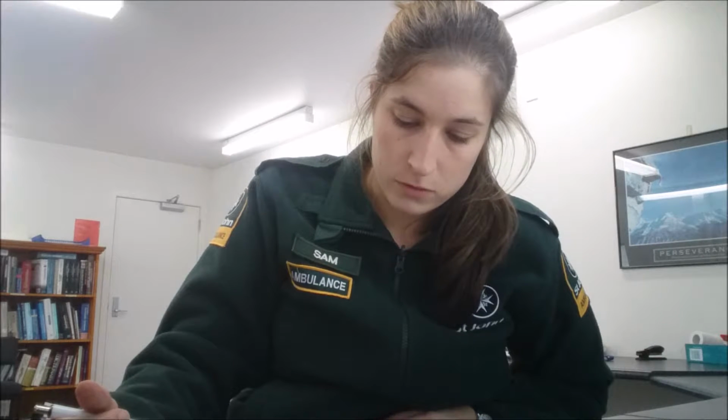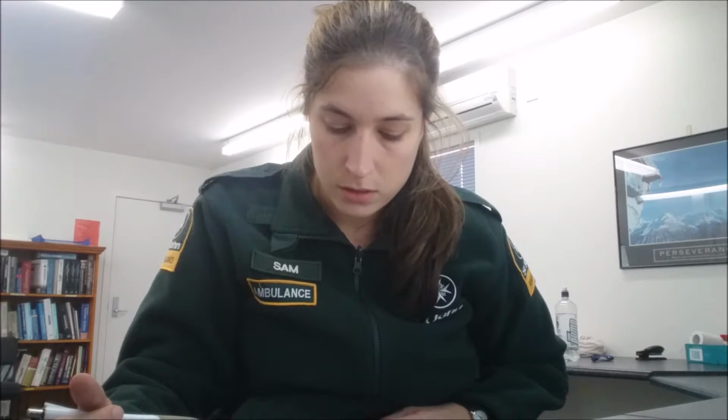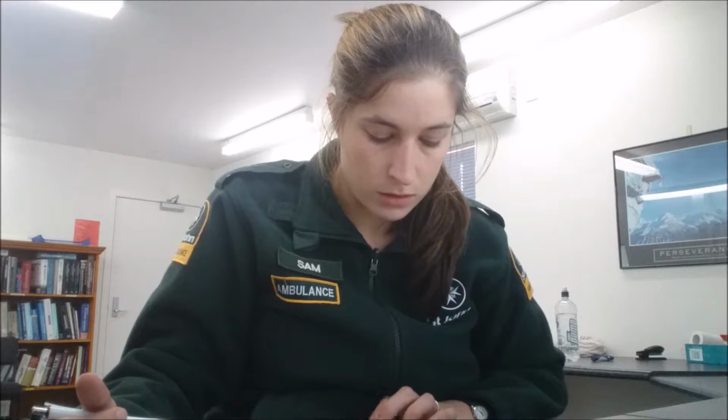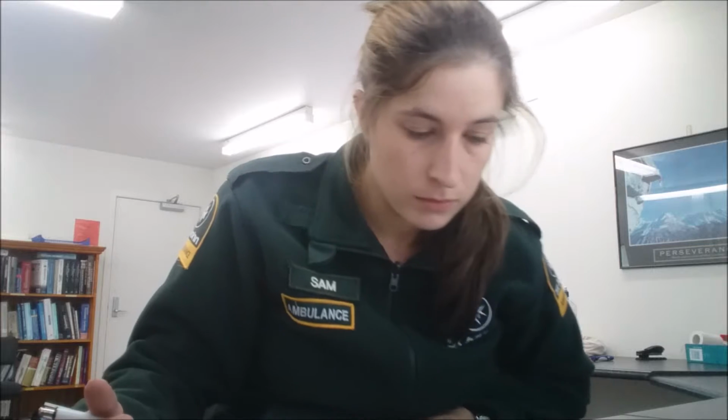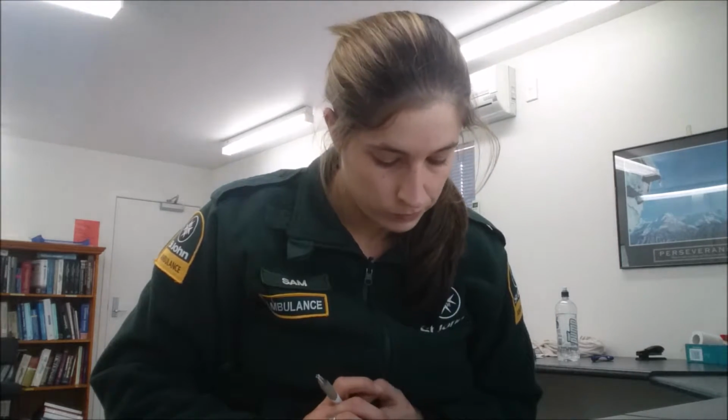Alright, so we'll do the interpretation. We'll go for first degree heart block with some right atrial enlargement, with P pulmonale waves, especially in lead 2, which indicate the RAE. Cool. Okay. So that's at 6 minutes 40 seconds.